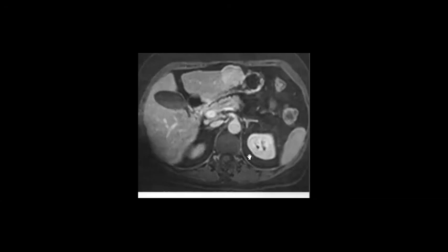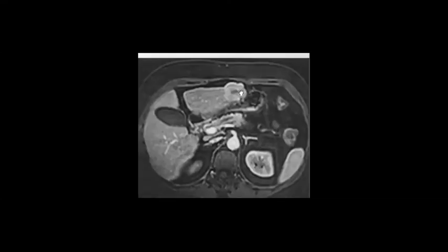It is less likely to be adenoma because you can clearly see the scar here, which is not typical for adenoma. It could be fibrolamellar, but there is no feature of malignancy, local invasion, or lymph node metastasis. It needs to be discussed with the MDT team for management, so MDT referral. And you will ask in the history about oral contraceptive pills and maybe discontinue them.